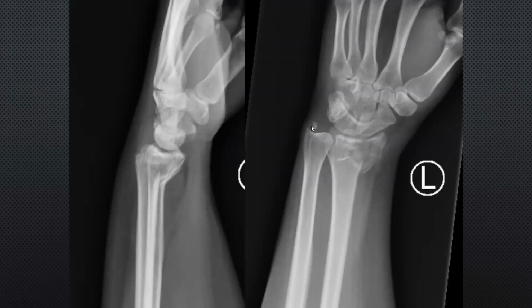What about the styloid process? Displaced, disrupted. So fracture here also. Clear? Yes, sir. Okay. So congruity, even here, the carpal bones are normal. Can you see the congruity here? The widening is normal here, normal here also. The space, the curve is normal. Like that.